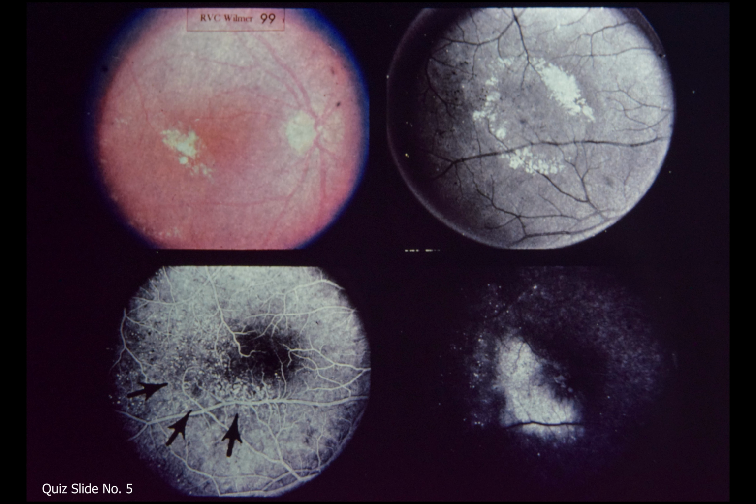This patient was treated with photocoagulation, and 6 months later, vision improved from 20/50 to 20/30. Additional photocoagulation was performed at that time to obliterate the remaining leaking vessels, and visual acuity subsequently improved to 20/25, where it has remained for 1 year.